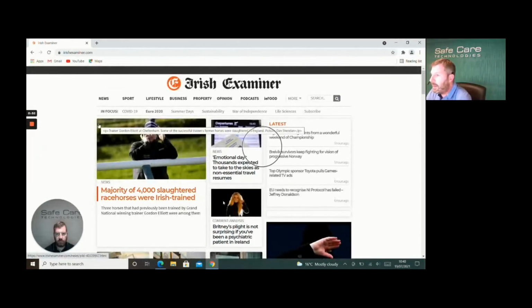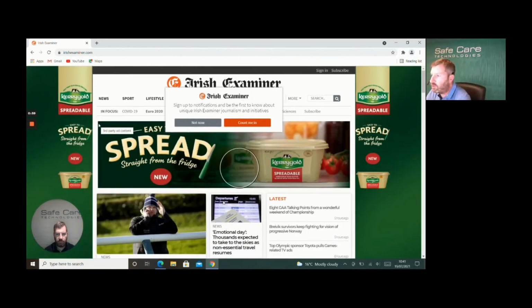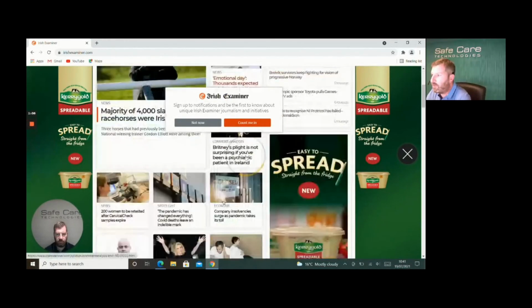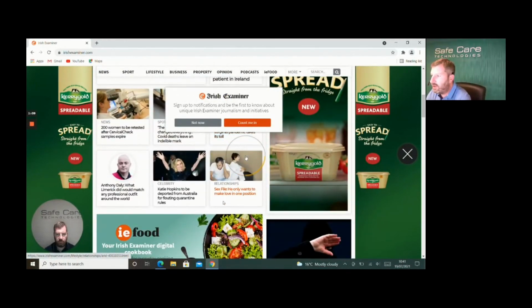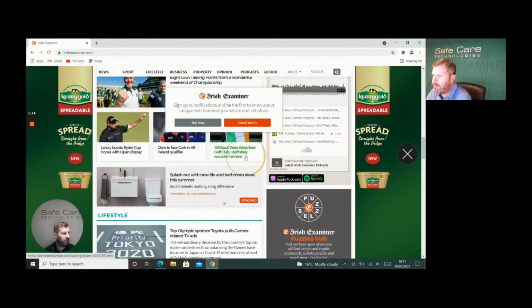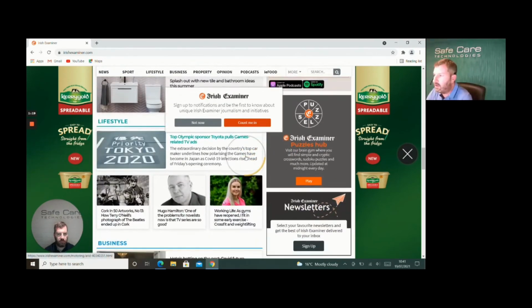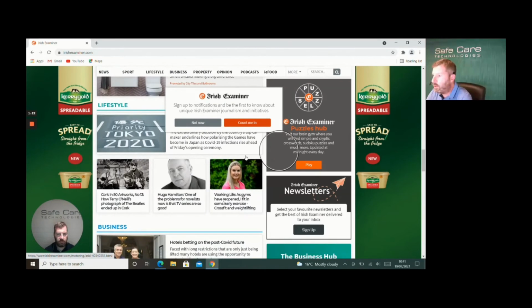So again, I can look around the screen without lots of things happening, wait for the page to load, and now I want to scroll down. So again, I'll fixate anywhere on the screen, bring up my menu, and now I'm going to use the scroll function. So now it just tracks my eye wherever I'm looking. So I can scroll down through the screen, I can go fast or slow. I can go up, down, left, or right, depending on the page we're on. And then if I find an article that I want, I just use the X on the right, close it down, select what I want to read, open up, and click.